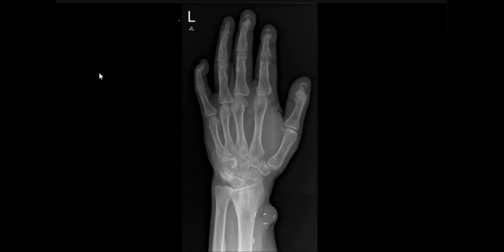In frostbite, the weather is so cold that the patient gathers all fingers with the thumb in the middle, covered by the fist, so the thumb will be spared. It is not spared here. So other differentials are present like hyperparathyroidism and scleroderma.